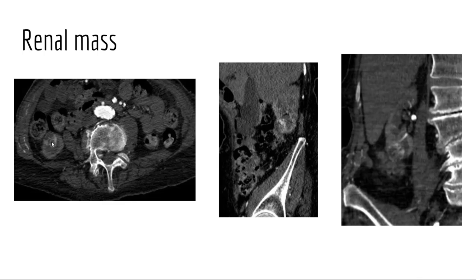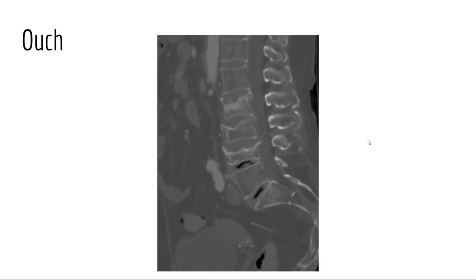Another patient with a nice tumor on their kidney, just showing that every little image counts. This patient had leg weakness, essentially normal vessels, but these compression fractures, and we can kind of see a disc bulge at L3/4, possibly causing their symptoms.